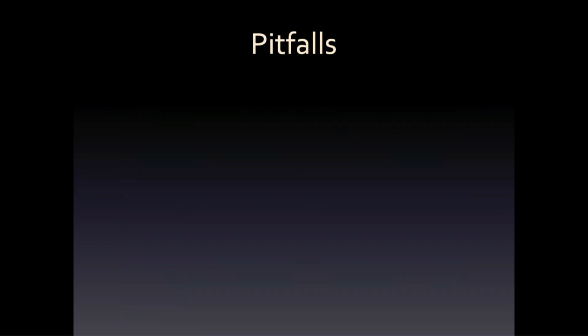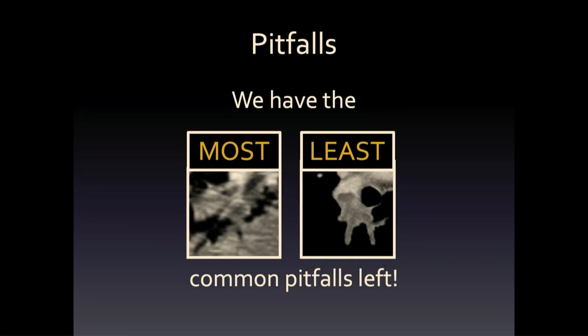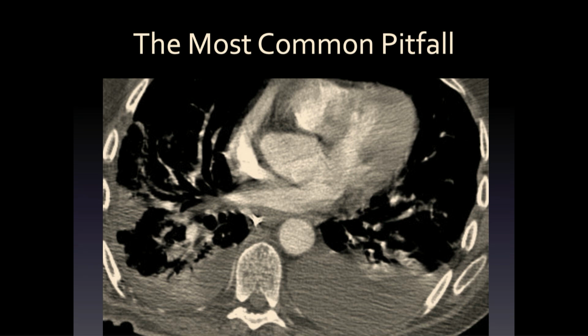All right, so for pitfalls where we practice our rules, we've gone through many, but we have left the most common and the least common pitfalls. What is the most common pitfall? Beautiful PE studies that look like this.